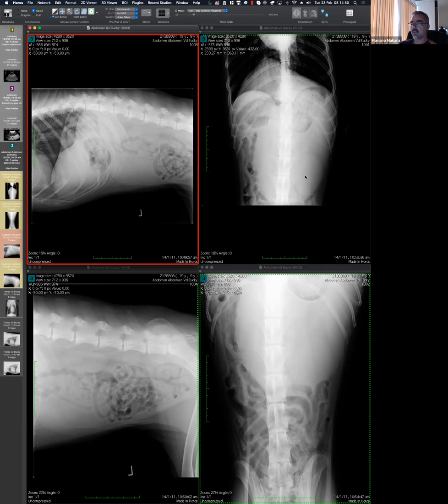But the distribution of the small bowel is another point that usually goes kind of unnoticed. We usually pay attention to the small bowel just to judge whether it is distended or not. But it's very useful as a telltale for mass effect, so things moving around. And I would say that probably every gas-filled structure in the body, trachea, airway, stomach, colon, small bowel, they are beautiful telltales about the positioning, because they are easy to identify, and it tells you probably not so much about themselves, but about their neighbors, okay?